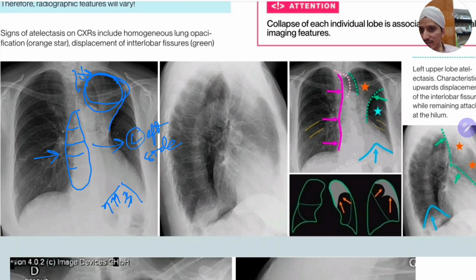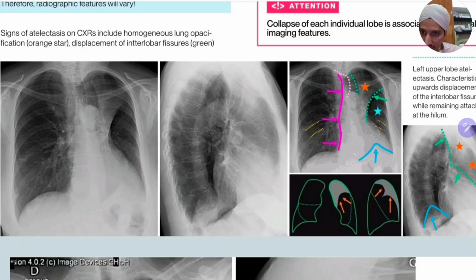You can see the blackish air now. So this trachea is displaced to this side. Also, you should see the spacing of the ribs. If you see this part of the lung, the space here is much more than the space between these ribs. So the intercostal spaces in this chest X-ray are reduced here, and increased here.